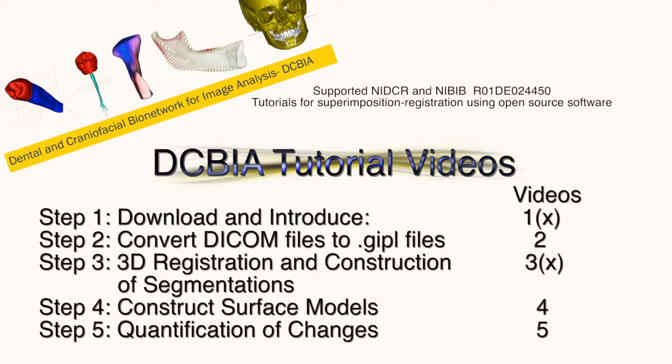Note that you must unzip all files before using landmark registration, because the registration doesn't work with zip files or with any file that has a dot in addition to the dot of the extension. Zip files that don't work are .gz, .zip, and .tar. Files that are okay are GIPL, NRRD, and IMG: .gipl, .nrrd, .img.